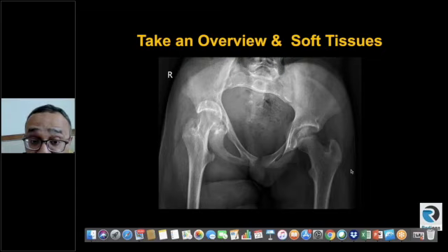So suddenly you start thinking, could this patient have elephantiasis for that matter? Or with that kind of appearance, you think about neurological things. You have to consider whether she's got plexiform neurofibromas. So this is a patient of neurofibromatosis.